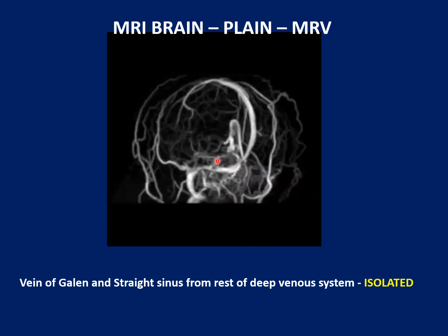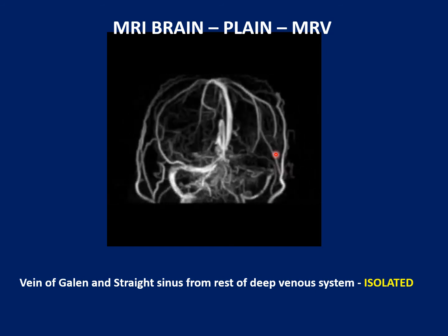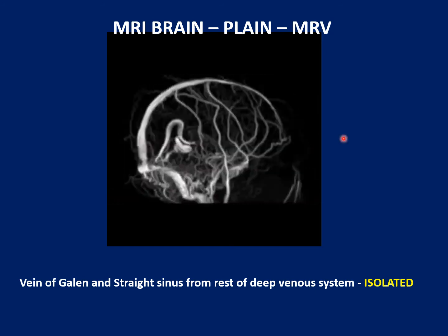This has a very important clinical implication, that it goes into a Borden type 3 kind of anatomy. We'll discuss about that later.